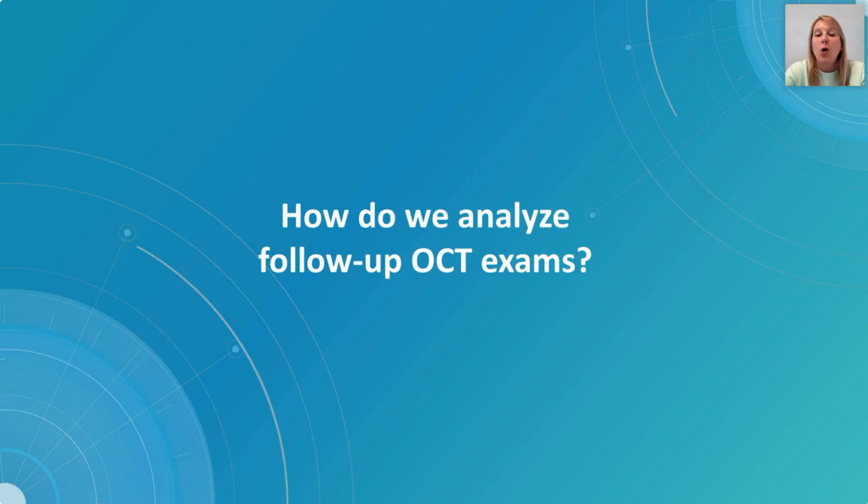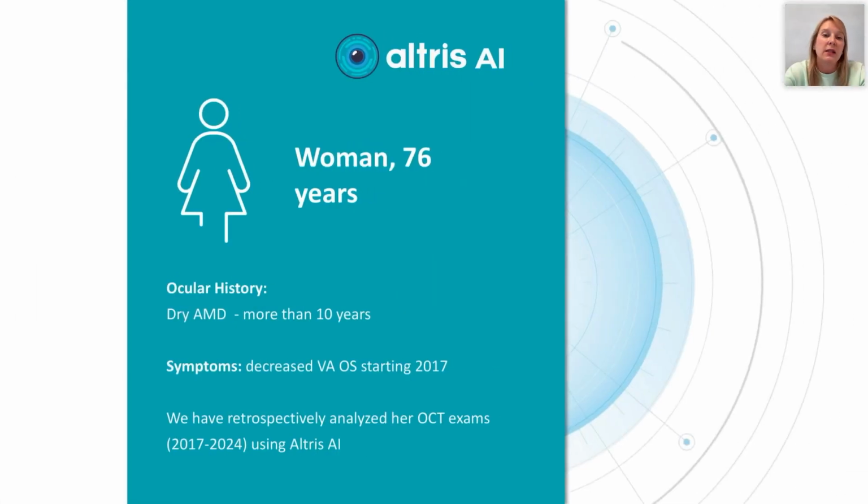So before AI, how did we analyze follow-up OCT exams? Let's take one clinical example of a 76-year-old woman who had a dry AMD history for more than 10 years. In 2017, she first came to our clinic, and we found a dry AMD.